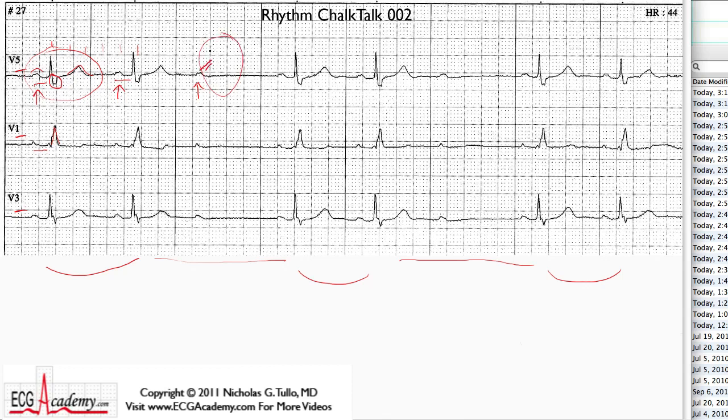So it appears that AV block had occurred, because this P wave never got down to the ventricles, and somewhere in the AV conduction system the signal never got through. Well, let's keep on going. Following this pause, there is another PR interval that's 0.2 or so, another one that's fairly constant, and then this P wave blocks. And so you have AV block with a fixed PR interval.